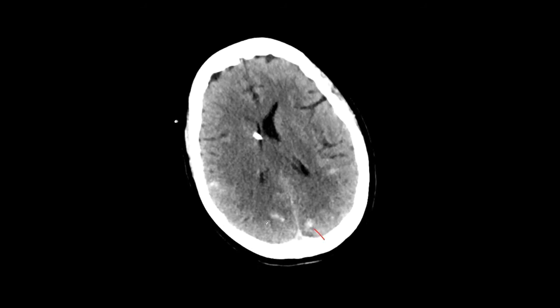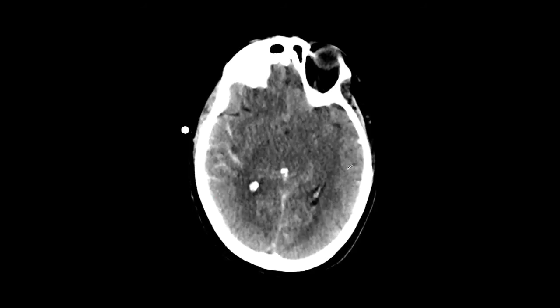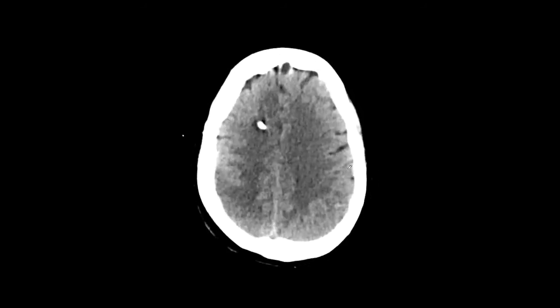And you start seeing hemorrhages. The subarachnoid hemorrhage is still there. There's still edema in the brain. You don't see the sulci and the fissure as well. So what happens when you have subarachnoid hemorrhage? You start seeing new infarcts as you get your follow-up study. So there is a new hypodensity that is developing, which was not there before.